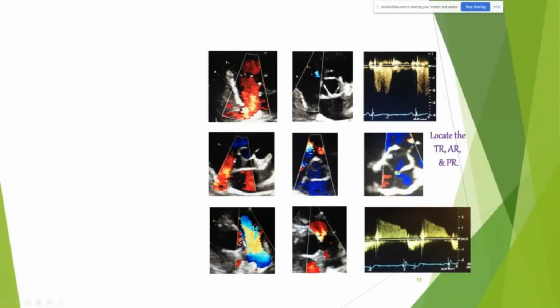So what would this one be? Okay, so that one would be the aortic. No, this is tricuspid. Oh my God, I'm sorry. No worries. I mean, it gets you. It's okay. They'll come where you'll just see them and know. I'm telling you, today is not my day.